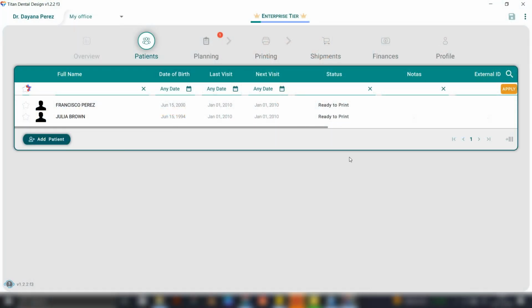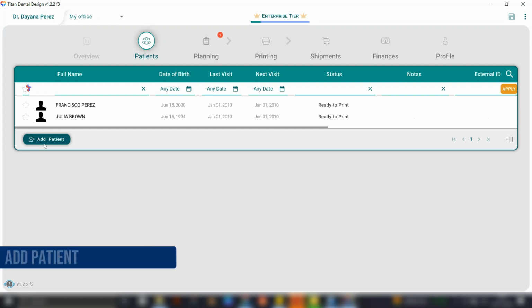Hello, everyone. In this video, we will learn how to submit a complete case to Titan Lab using Titan Dental Design. This service allows doctors to delegate the aligner planning and production process, ensuring everything is done professionally and efficiently. Additionally, we'll look at how you can review, request adjustments, and approve the schedule to ensure the treatment is perfect before printing. The first step is to create a new patient within the program.